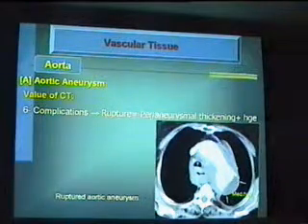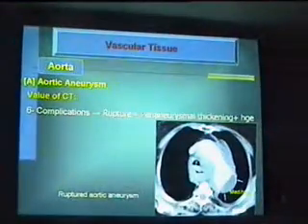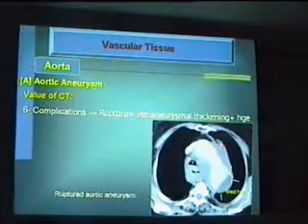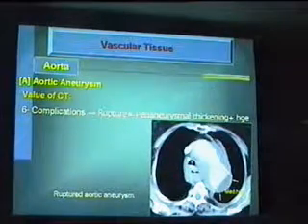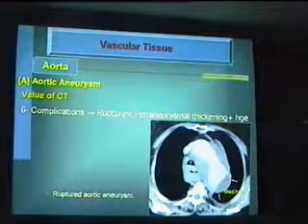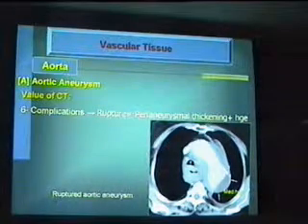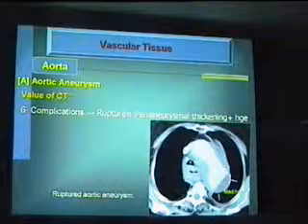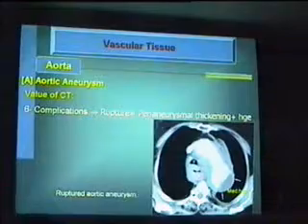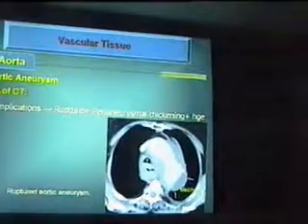Okay? Then this is the arch, and going down and down I find a part that is not complete, and the incomplete part is the attenuation of something around the aorta. What could be the problem in the aorta, because it is large and around it there is something that reads hemorrhage, from 60 to 70 Hounsfield units. So this is most likely a ruptured aneurysm of the aorta, and this is the perianeurysmal hemorrhage and the thickening in the wall. Okay?